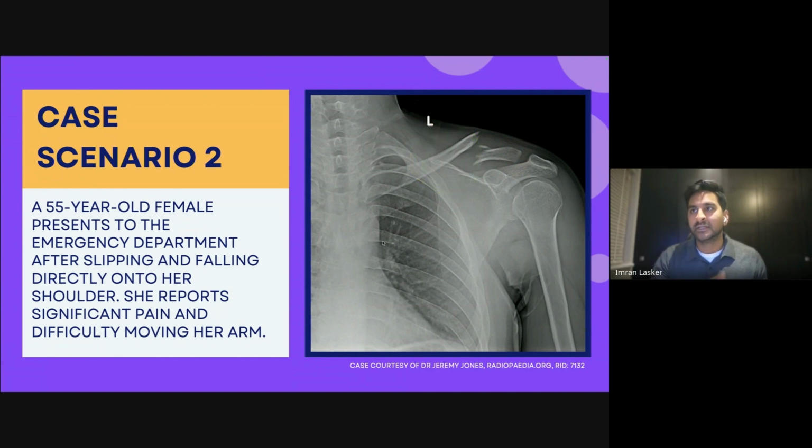Open fracture, to be honest with you, on x-rays is very difficult to tell because that's your skin. I can't tell what that's gone beyond. Very, very hard, unless you've got different views where you can really see it sticking out. Personally, when I'm reporting these, I won't even bother saying open or closed fracture. I just say mid-clavicular fracture with significant malalignment with multiple fragments as well.